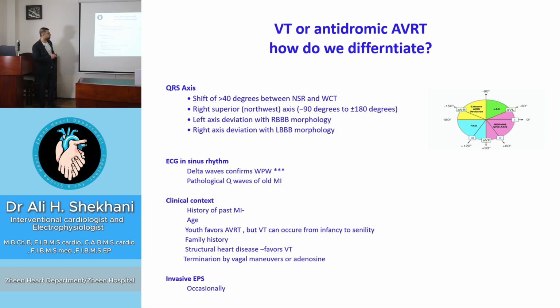And also you have to have an ECG during sinus rhythm. Sometimes the patient may have pre-excitation during sinus rhythm. It will give you the diagnosis. Or if the patient has pathological Q wave in the sinus rhythm, you can say this is VT. And history is very important. Every ECG should be interpreted in the context of history taking.